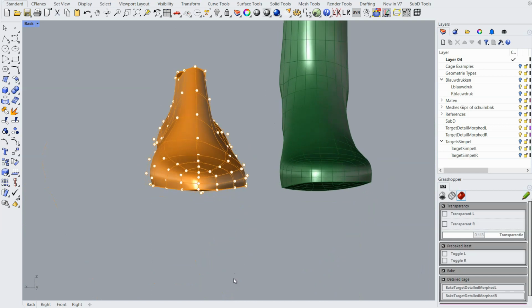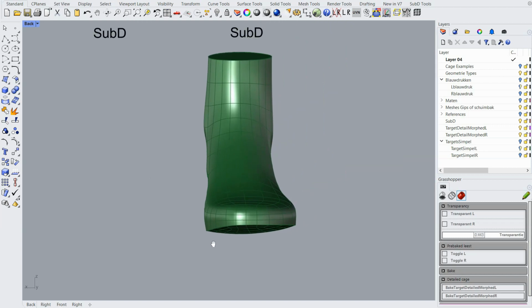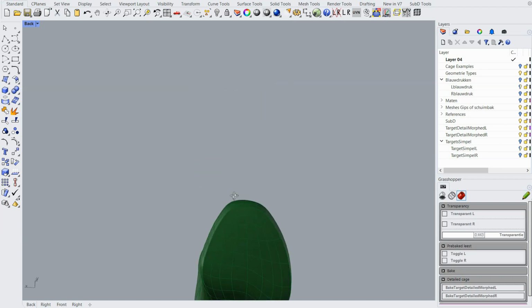And defining the last is always a struggle between the amount of control points you need to define the shape and to have the detail you want in your shape, and how easy it is to deform the shape in a meaningful way.